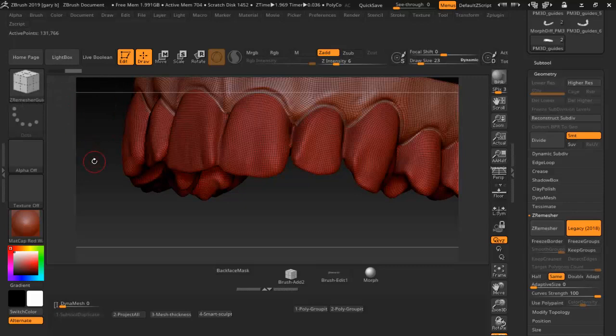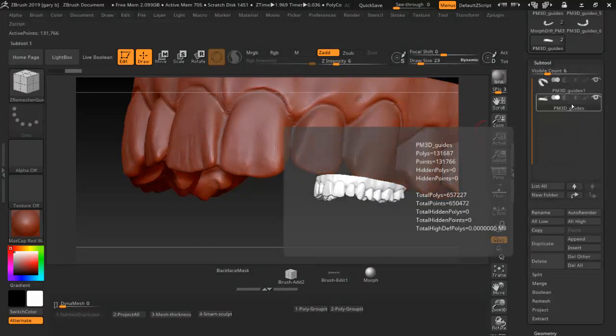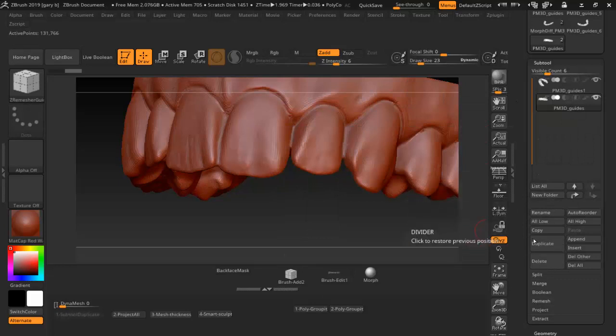Another thing I can do is turn off the poly frame and also look at it this way. Alright, there's a little bit there. I'm losing a little bit of detail here, so that's not a big difference. The reason why is I can go ahead and project that back on here. I don't think I ever did. That's what this project button will do here. So let's just go ahead and do this real quick.